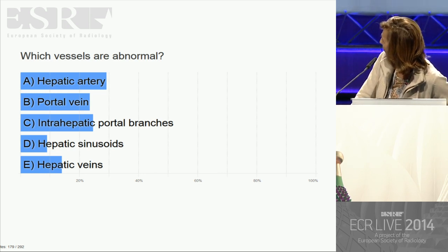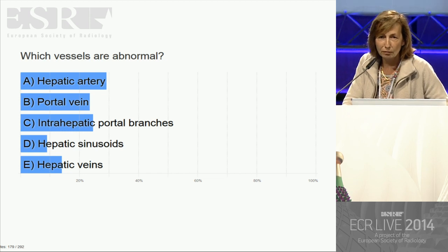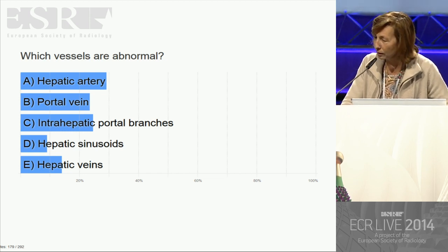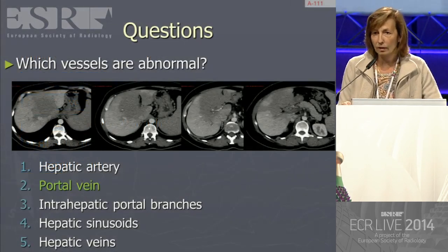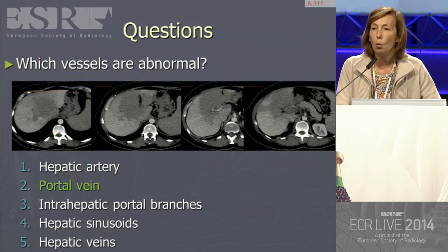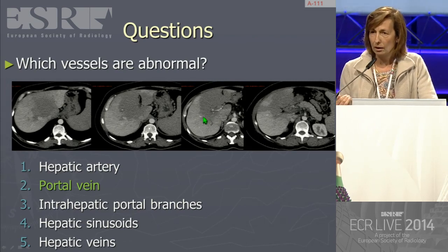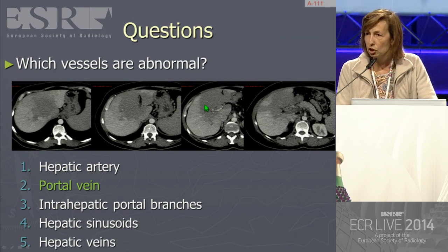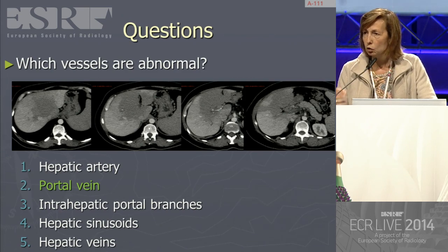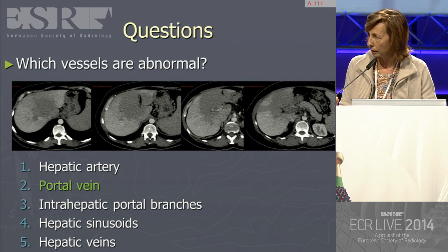Okay. I would say that you really wonder whether it comes from the hepatic artery or the portal vein. Well, this is already good. But the right answer is, it is portal vein, okay? So why? Usually, you know that the blood-liver flow originates mostly from the portal vein. It means that only 25 or 30% of the blood flow comes from the hepatic artery.